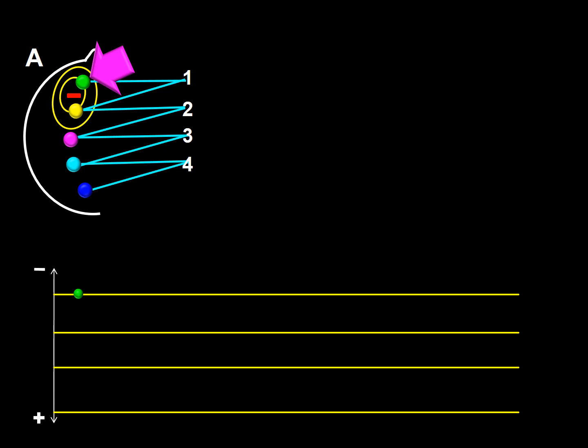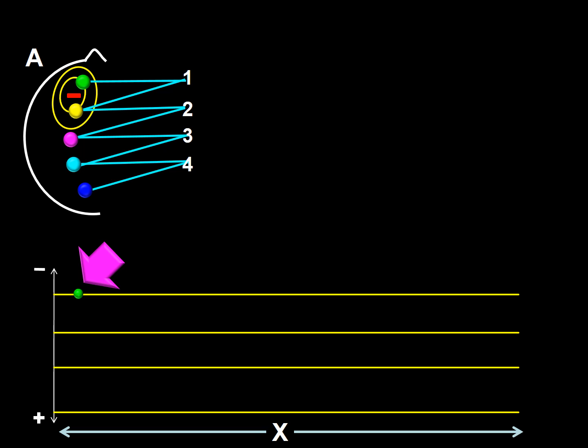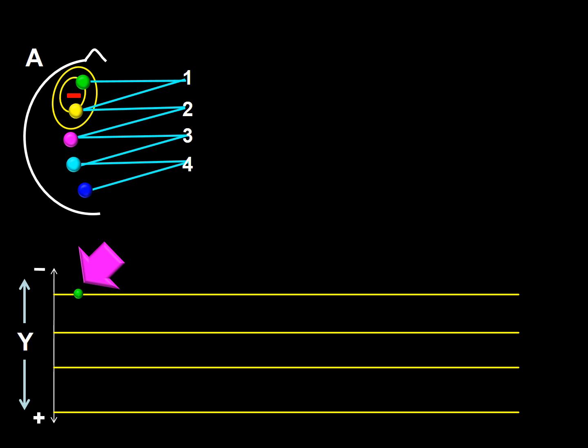We will start by plotting the electrode closest to the maximum of the electrical field. In this case, the green electrode. The location of the green electrode is at the beginning of the polarity graph since it is the most anterior electrode. The location of the electrode in relation to the chain establishes its x-axis localization. It is its relative amplitude that establishes its y-axis position.